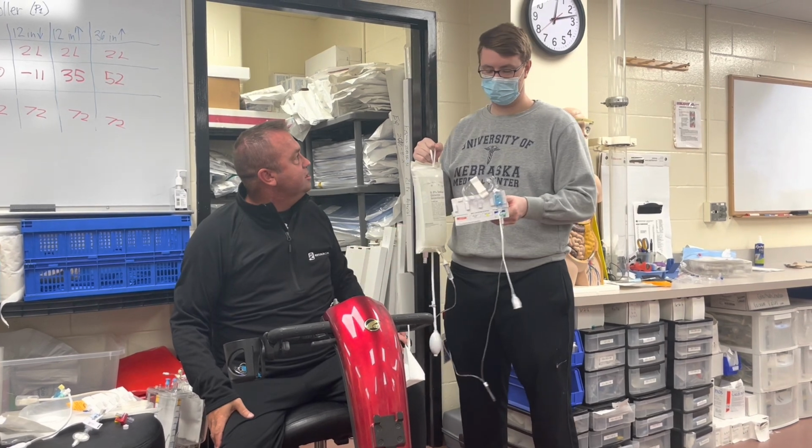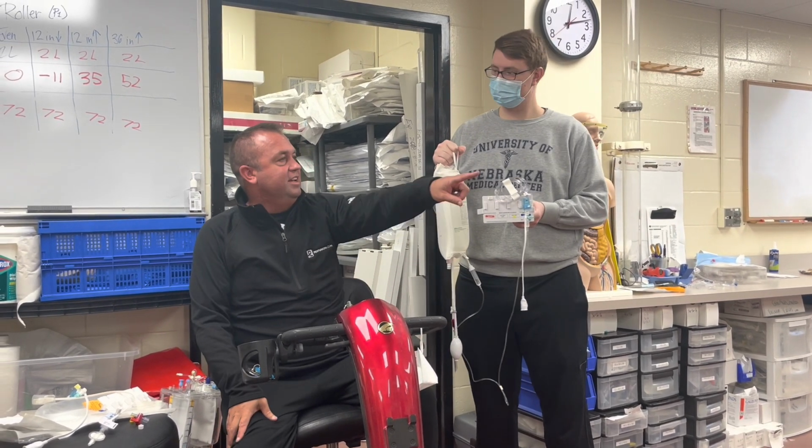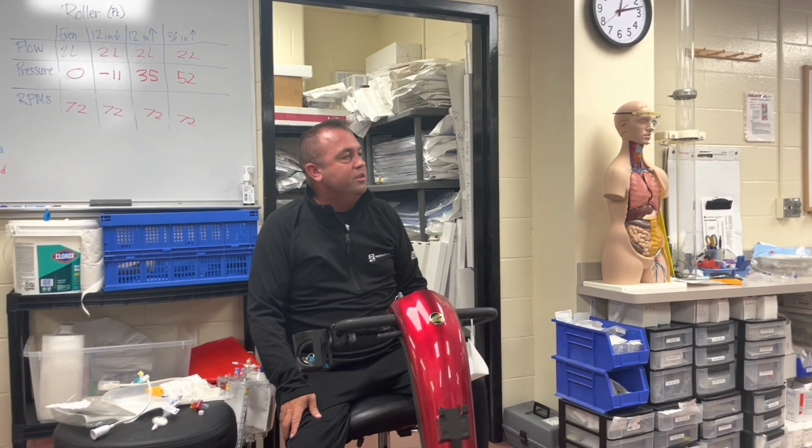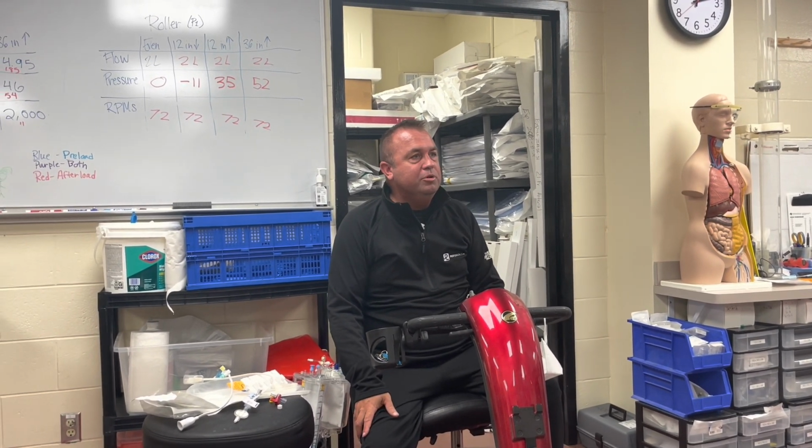Everybody see how that works? Stephen, you can just hang that on that IV pole there for right now, and then we'll use it in the next lab group.